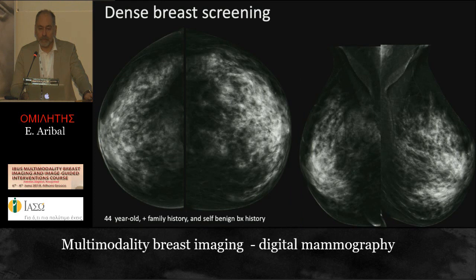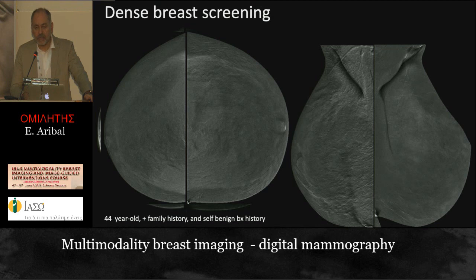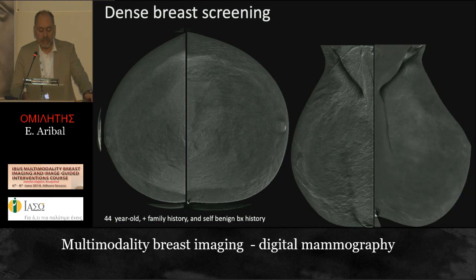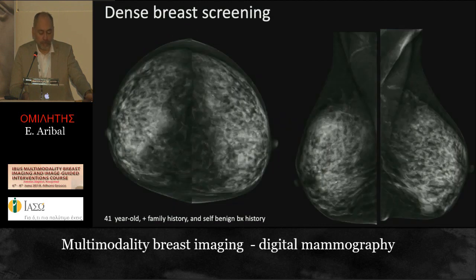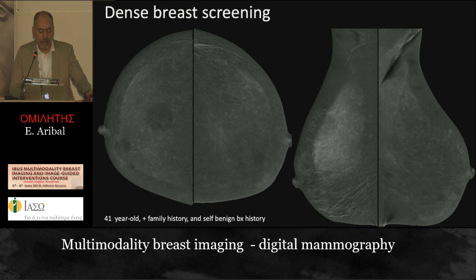We also sometimes use it for dense breast screening for high-risk patients because they cannot go into MRI. So we prefer to do the contrast-enhanced mammogram, and you can see the breast clearly, although the breast is very dense and dirty with calcifications, so you can safely send the patient home for 1 year. Another case with a lot of lesions, a lot of cysts you see here. Also, contrast-enhanced mammogram has background enhancement, here you see, but it's not as evident as MRI.